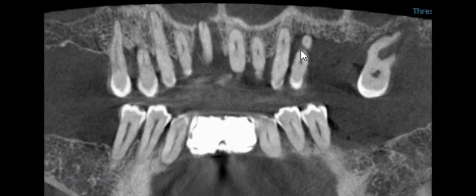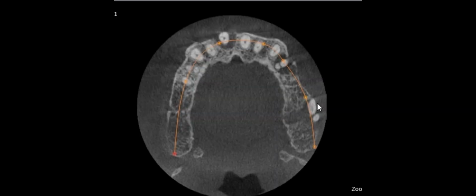This tooth here, again, as we were explaining before on the 3D image, this tooth here is no good. Bone lost to essentially the tip of the root, and same with this tooth right at the back on his upper left here, not really supported by bone. And you can see the floor of the sinus is just here, so the bone in this area is absolutely minimal. And let's go to another cross-section of the 3D X-ray.